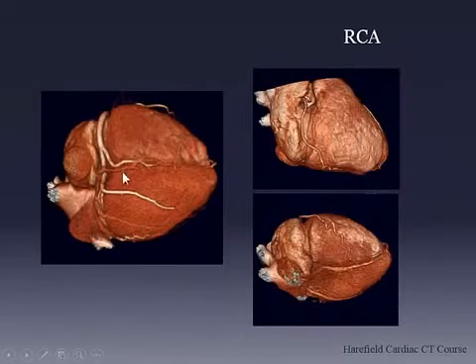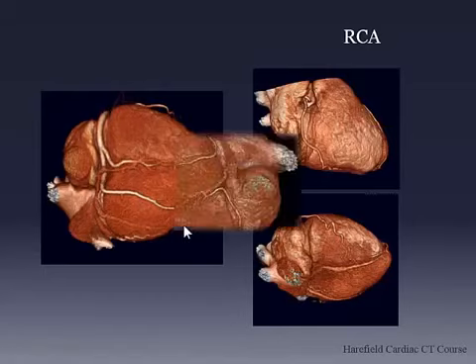Okay, right coronary anatomy again. Although the PDA traditionally arises from the crux, which is this bit here by the posterior AV groove, it can arise early, and it can actually arise extremely early. And similarly, you can often get larger branches coming off the PLA.